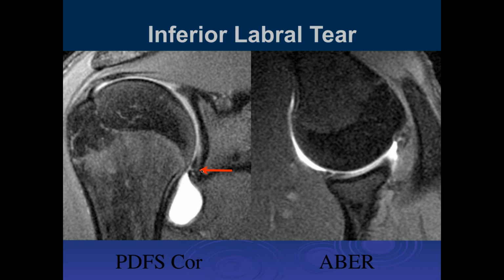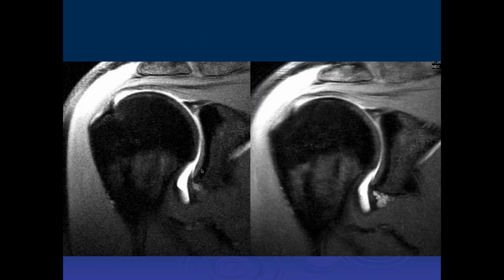So here's a typical inferior labral tear, as you can see here.